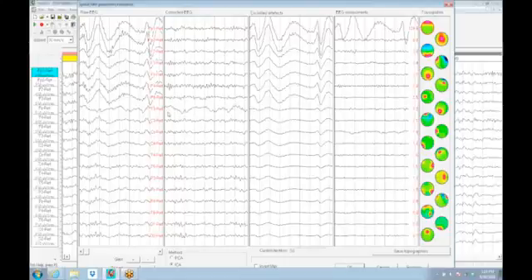Remember, the entire T3 had an irregular baseline wander to it. That's this component. But when you select that, you also virtually flatten out the T3. So this is not always the best way to fix something, but it's done a very nice job with the eye movements. Now, if you look very carefully, there's small little wiggles here that, you know, we wanted to take out all these big things that we thought of as eye movements, but it's pulling some small things out here too.